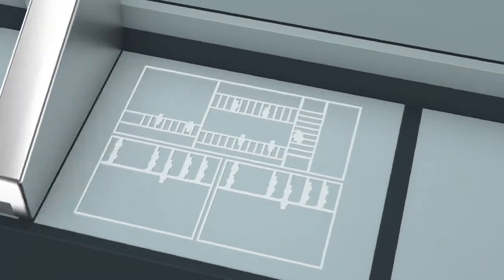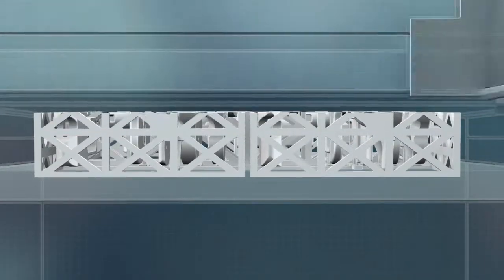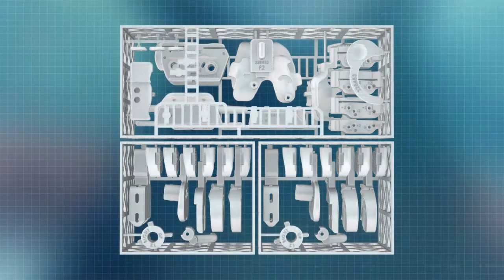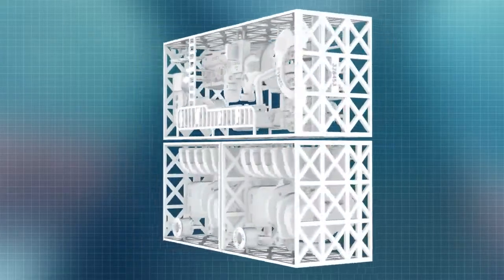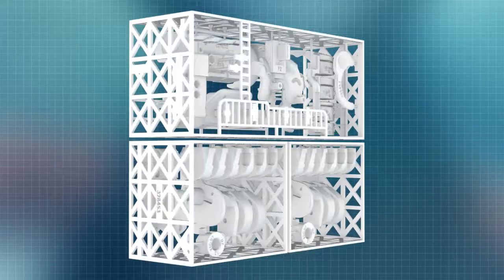Conformis has pioneered additive manufacturing and 3D printing technology for producing single-use patient-specific iJigs. Instead of reusable instruments that require cleaning and re-sterilization, iJig positioning guides come pre-sterilized and are used on only one patient.